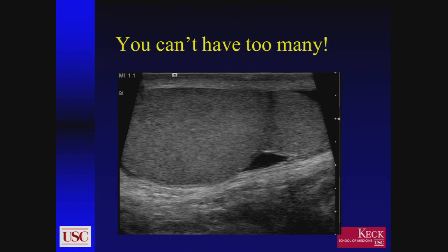And so they would torse and detorse on this poor guy, and he would present with testicular pain. So unfortunately, as many cases happen in our county hospital, he got lost to follow-up. But do remember that as a scrotal mass, sometimes you can actually see that there is a supernumerary testicle. Three is the more common. In this particular case, it's actually attached.